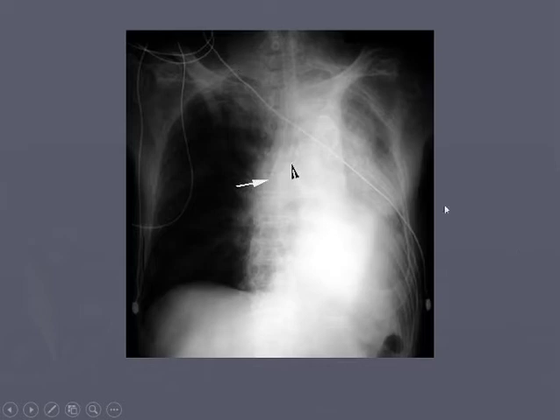E for everything else, we've got lines. What's this in his throat? Coming down here, the tip. Why, that's an endotracheal tube. Carina's up here, buddy. So whoever intubated this person went too far.